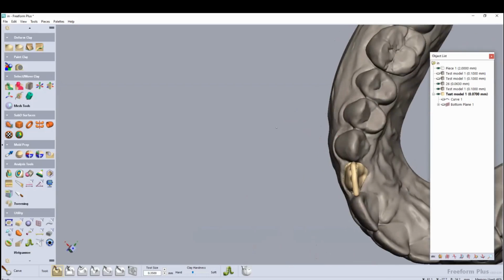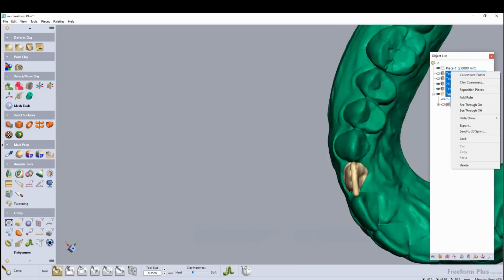Functions will be repeated again and again, and I will show you how they work. I will try to show everything, but if you have a question, you can write to Basim, and Basim will send me the questions, and I will answer all questions the next day. So let's get started with the import of the model.